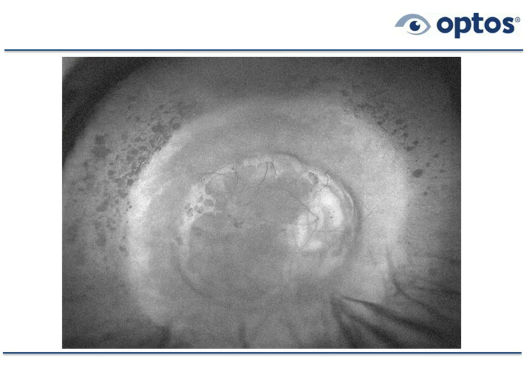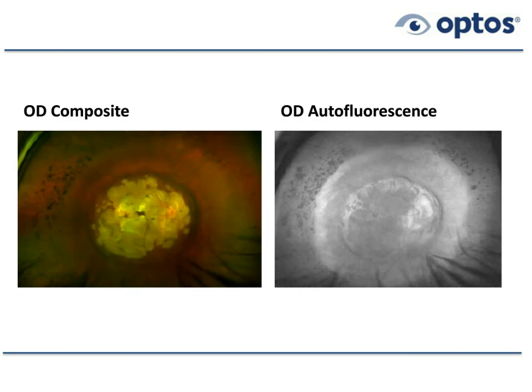In any instance, at first glance, you can certainly get this confused with retinitis pigmentosa with these rings as well. So those are the only two that I've encountered that have these kinds of rings. And there's the composite of the right eye. And we're getting perhaps some additional information with autofluorescence, more areas of abnormality.